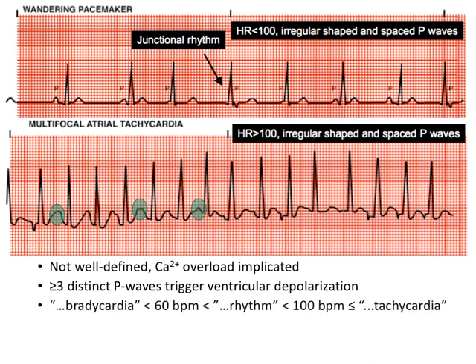Now the reason it's called tachycardia, like I mentioned before, is only because the heart rate's over 100 beats per minute. And you can kind of think about the distribution as follows. If it's bradycardia, the heart rate is less than 60. Normal is within the range of 60 to 100, and then tachycardia is simply anything over. So we just name for the rate the high accelerated heart rate here, and the multifocal nature is described by the multiple P waves.